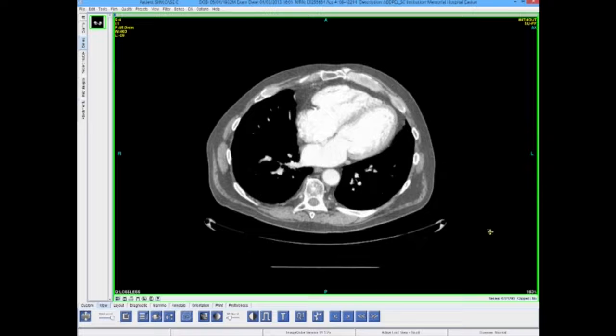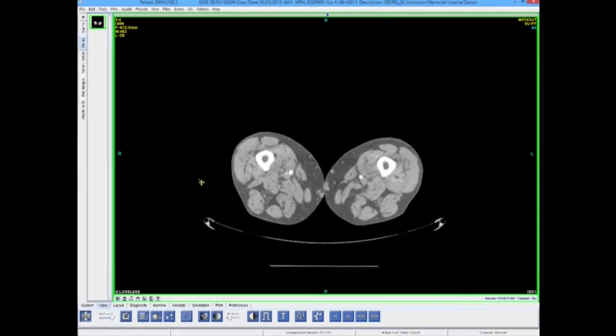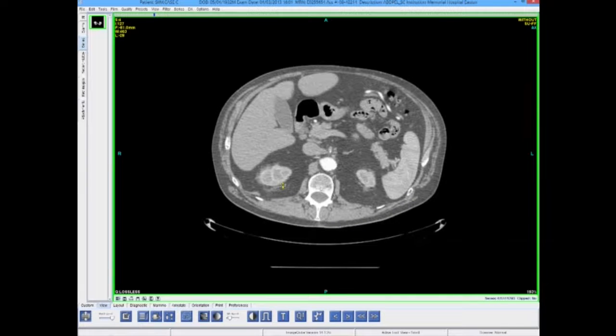When the mouse speed is 10, the study should be displayed in a path from left to right.